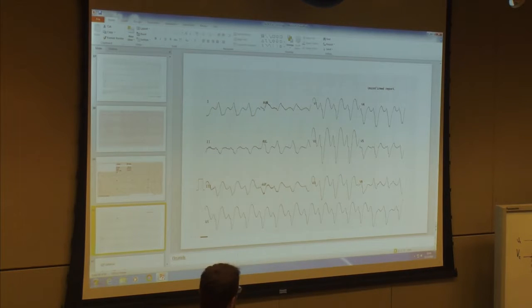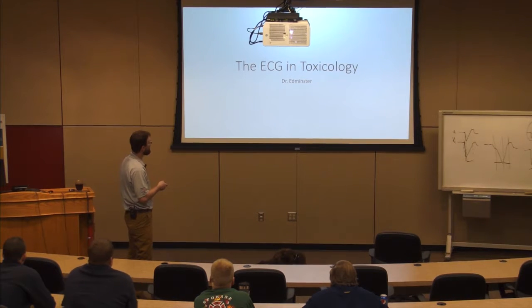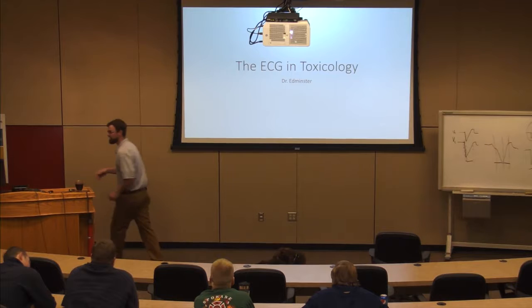Here's another one. Flecainide was on that list, right? Flecainide, an antiarrhythmic. Well, I got a bizarre wide complex rhythm that doesn't really fit anything, right? You're starting to see what bizarre looks like. Bizarre looks like something that doesn't fit nicely into a box and I can't package it somewhere. Well, now you've got a whole other compartment for things that look bizarre called your sodium channels, right? And how am I going to put them there? With a prominent R wave in aVR, right?